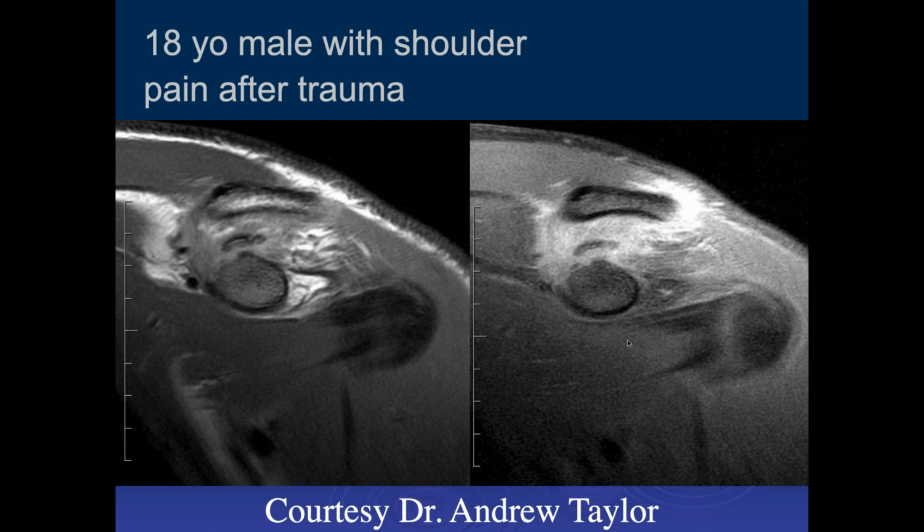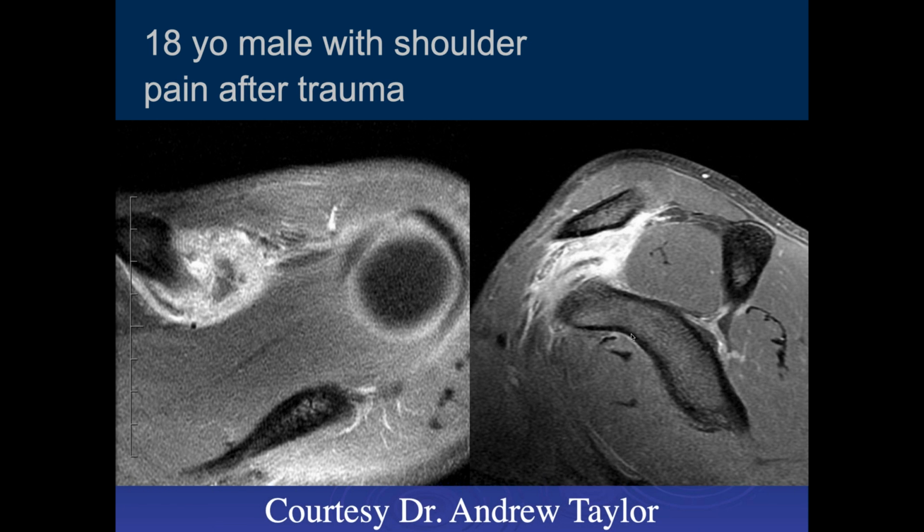Okay. Here we can see separation or disruption of the coracoclavicular ligaments, and there's also a displaced ossific fragment. Oh, this is an avulsion. That's actually an avulsion rather than just a tear through the ligament. You can see the bone avulsion coming off there.